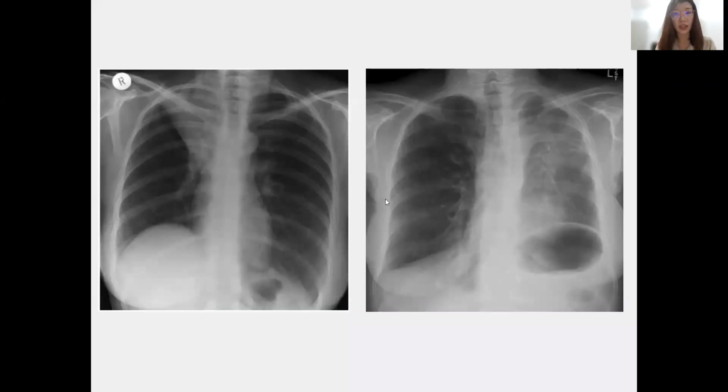Please type the answer for this X-ray and also this X-ray. Easy one. So the X-ray on the left-hand side, we do that first. Do you see my arrow? You can see my arrow pointing, right? Yes. Okay, so we have answers coming in.